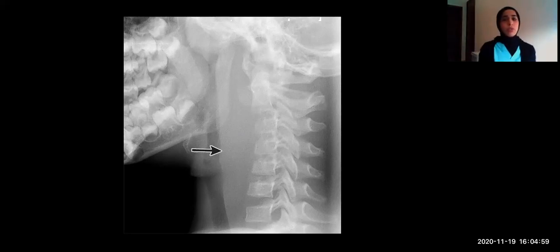Most retropharyngeal abscesses and inflammation are preceded by upper respiratory infection and rupture of one of the inflamed lymph nodes, which gives you cellulitis and subsequent abscesses. Early diagnosis and early detection of this thickening may prevent further complications of abscesses, large cellulitis and phlegmons. So here you can see a very thickened prevertebral soft tissue causing narrowing of the airway column with anterior displacement.